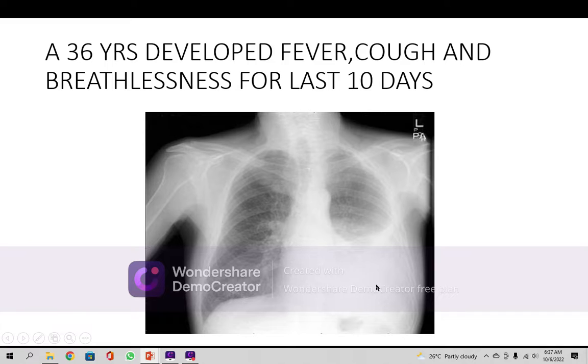But this type of pleural effusion can occur in other conditions as well, that is chronic inflammation, as in tuberculosis. It can also occur in conditions like congestive cardiac failure, where you have given furosemide in heavy doses, so the resolution of the pulmonary edema is a remnant of it.